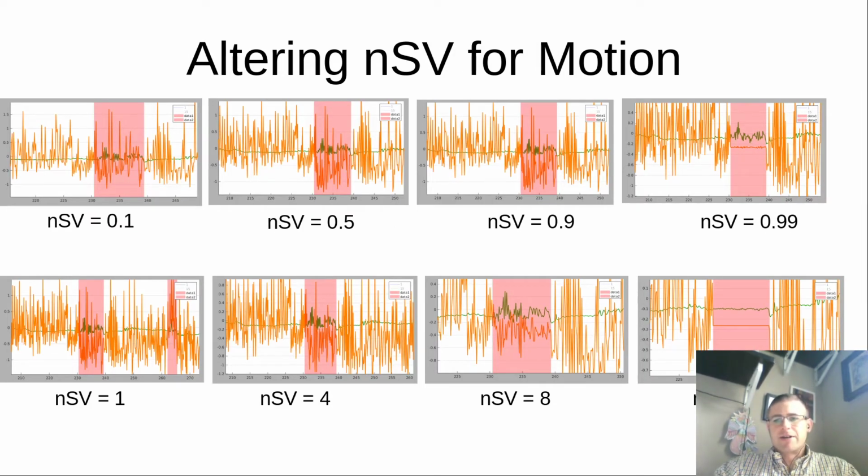And this is what it's doing. This mimics the last slide, or a few slides back, where I actually changed the NSV value from 0.1. I just jumped ahead to 0.5 so you could see an obvious change, 0.9. And once you get to 0.99, you'll notice the area within this flagged section is very flat compared to everything outside. Nothing has occurred to anything outside the section. I've only treated everything inside the section. That's when you deal with the decimal aspect of it.